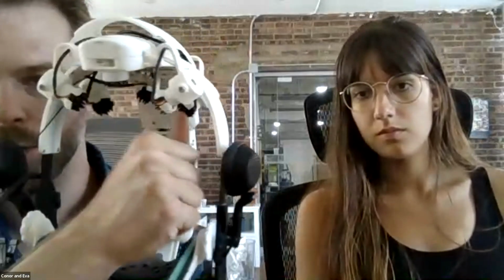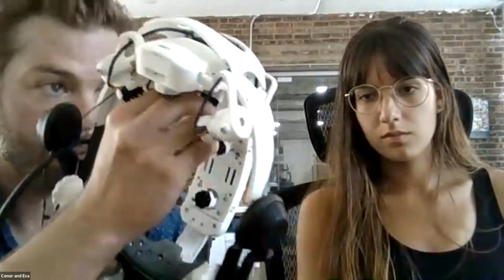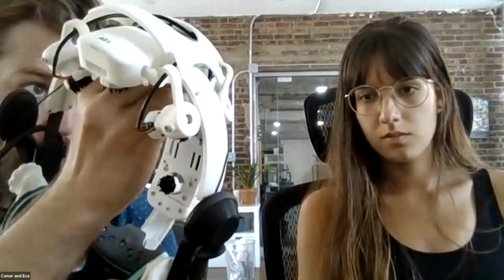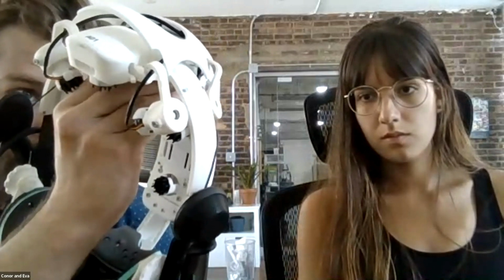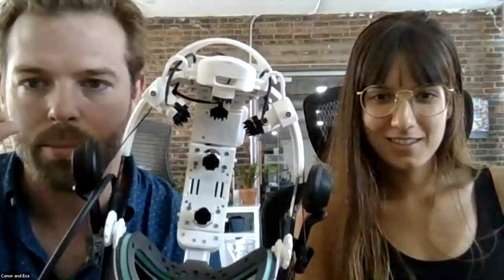And similarly, these are the active electrodes that have a PCB in them, but it's quite easy to pop one of these out. I probably shouldn't do this live, but I'm going to try to. Actually, I'm not going to do that. I'm going to leave that in there, but you've got to just trust us that those things pop out and then you can pull the polymer off and put a new polymer on.